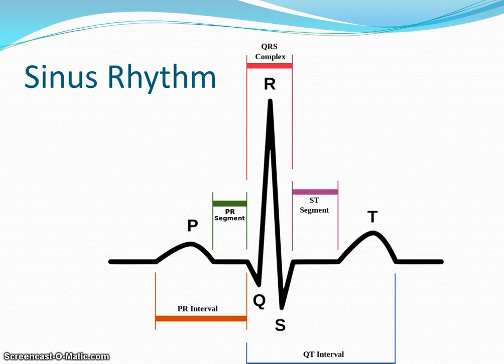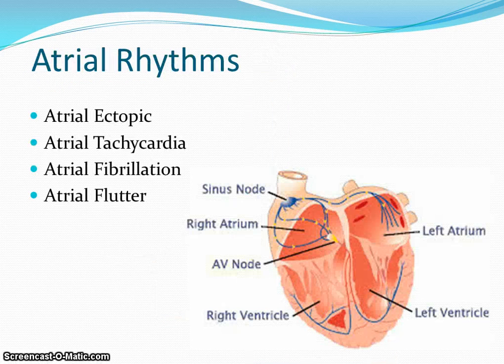Interpretation of abnormalities. Sinus arrhythmia is the interval between each R wave and can vary greatly due to inspiratory heart rate being fast and expiratory heart rate being slower. This could be associated with young adults and athletes. This can be seen immediately post-exercise.